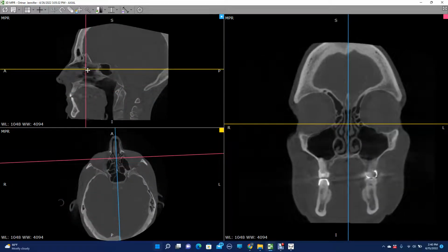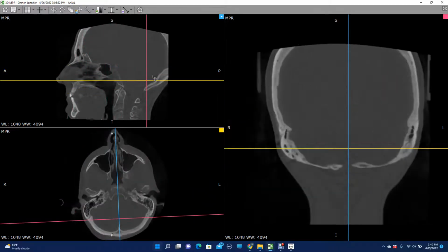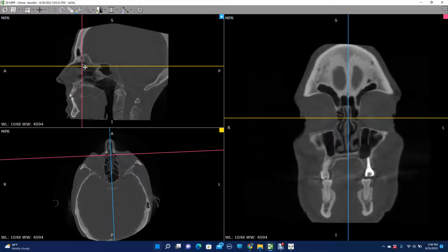And I start up at the eyes. Right, I'm moving on this field to change it on another field. So if I move my sagittal up towards the eyes and I can see my orbits, I do this technique called dimensional transpositioning. I'm looking at one image on the frontal to try to reduce rotation on my horizontal.